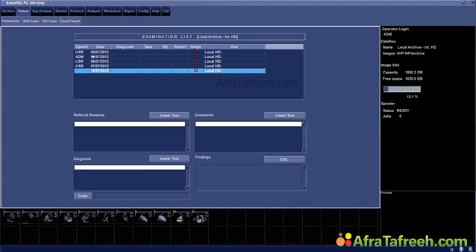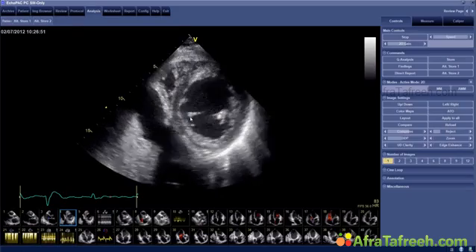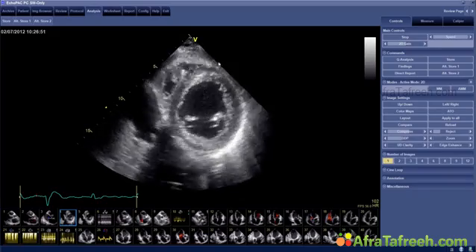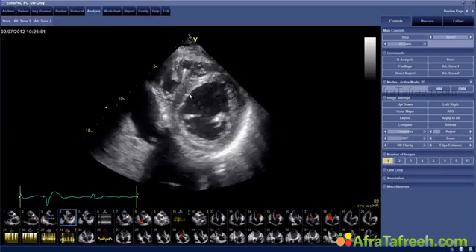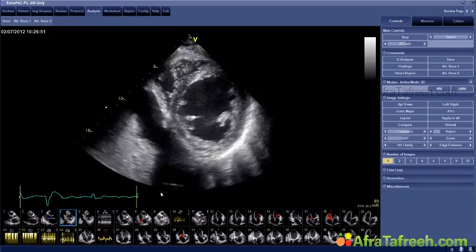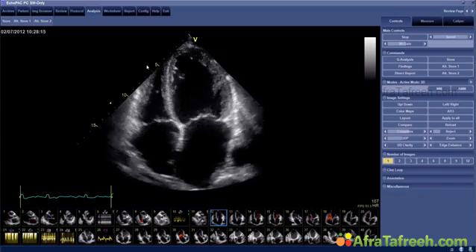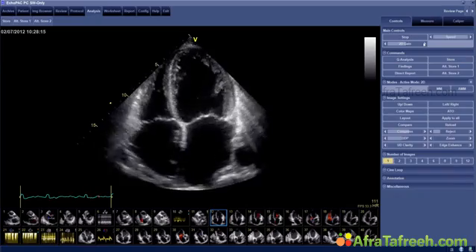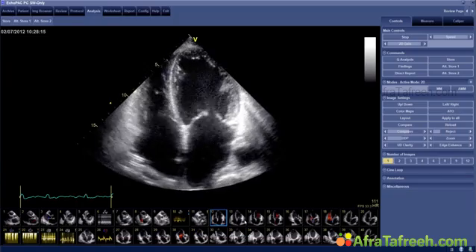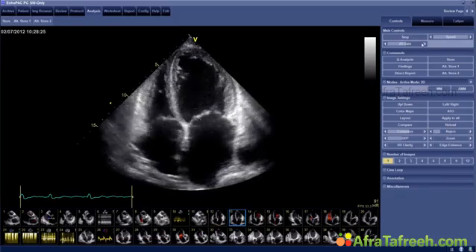I'll just show you a few images, and then I want you to see if you see anything abnormal. Now, this is left ventricular function, obviously significantly reduced. This is very poor left ventricular function. There's also dysynchrony. You can see a pacemaker lead in here. The patient also had an ICD implanted and a CRT system. Very poor left ventricular function. Very large left atrium. So I would say end-stage left ventricular dysfunction.